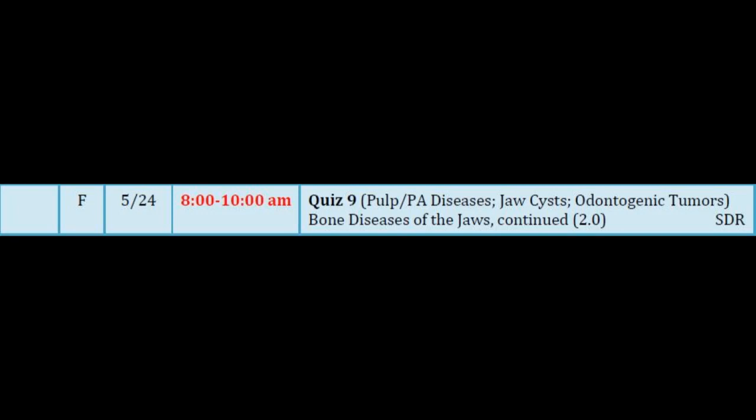In that picture on the posterior molar, did the osteosarcoma erode the roots? Or is that just... I don't know the story on this one, okay, so I can't answer it. This might have been a younger patient, younger than typical, and that's just a completely formed third molar because the first molar is missing. That's a third molar. Okay. So this is one that didn't read the book and got it before age 20.